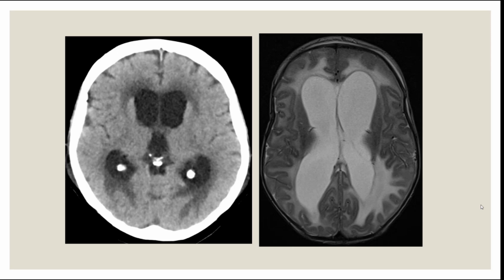It's very hyperintense. According to the Hounsfield units, what could it be? It's so bright. Okay, these are... it could be, but these are calcifications. It's calcifications actually that occur.